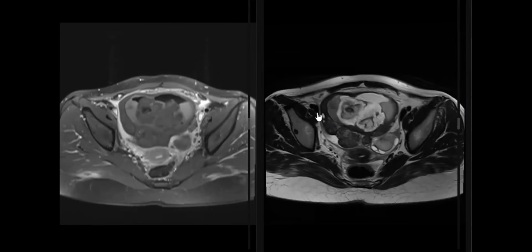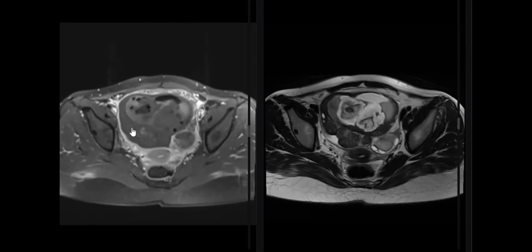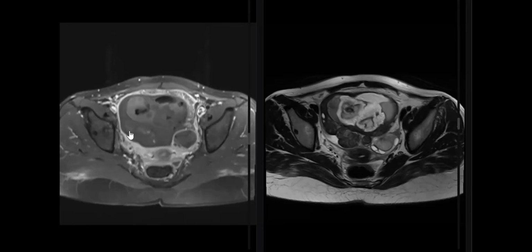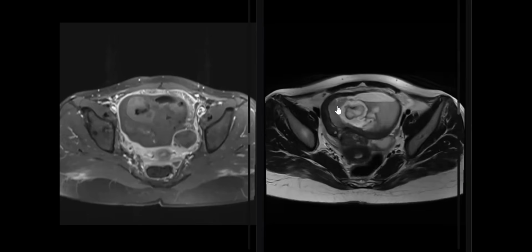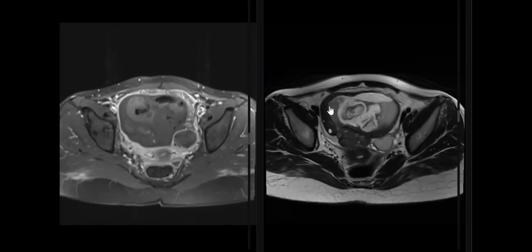What about the right ovarian stroma? It's a low signal and not showing any significant enhancement at all. You see, no enhancement at all, and very low signal on T2. It's chronic hemorrhagic infarction in this area. Usually, my friends, if we have a huge lesion like this, the stroma will be very thin, but here this is some sort of edematous stroma with hemorrhage inside. So this is a chronic case of a torsed ovary containing a dermoid cyst.